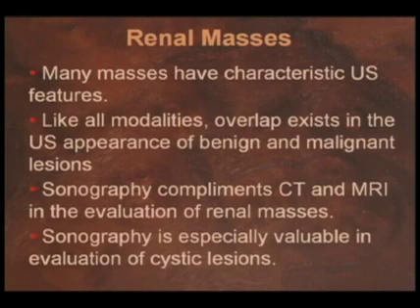So just in summary, renal masses often have characteristic ultrasound features, but like all modalities, there's a fair amount of overlap in the ultrasound appearance of both benign and malignant and non-neoplastic renal masses. So ultrasound should be viewed as complementary to CT and MR when evaluating renal masses, and it's especially valuable in evaluating cystic lesions.